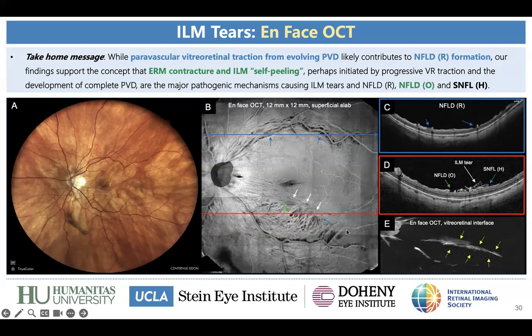So I think this is the most comprehensive approach that we can have: looking at each segmentation based on the patient's symptoms, and of course correlating it with the cross-sectional OCT, which is always fundamental.